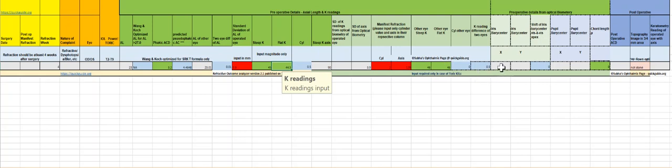The other notable thing that I wanted to draw your attention to is that in optical biometry we get something like angle kappas and angle alphas. It doesn't really say angle kappa or angle alpha. It actually points to the iris barycenters. Several of the optical biometers point to the iris barycenter and the pupil barycenter. If you look into the iris barycenter, it is the deviation of the optical axis from the corneal vertex. I say corneal vertex because you cannot measure the visual axis, and it is thought that the visual axis will be closer to the corneal vertex.